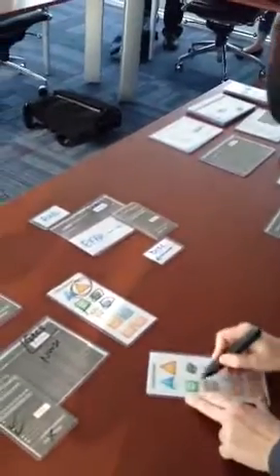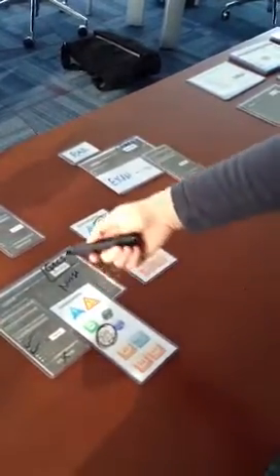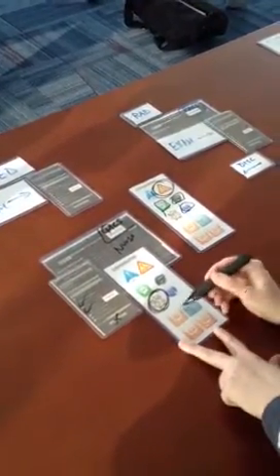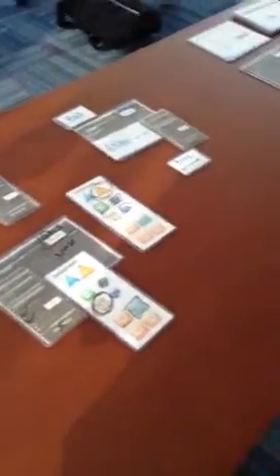Let's say an action hasn't happened quickly enough. An alarm or escalation process can be put in place. So if something's been on this work list for more than an hour, that nurse can get notified, or someone else on the team, maybe the supervisor of that charge nurse could be notified. So someone else within the process could be notified. We can even send information to other systems via HL7. So these panels pop up right on the nurse's workstation in the ER.